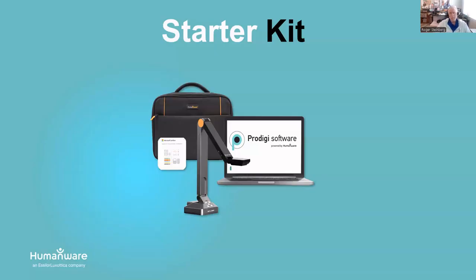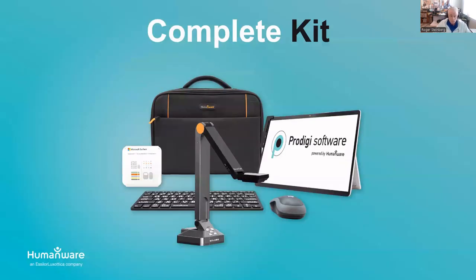On the right, you see a laptop, and this is sort of the setup that I'm using today. I'm going to use my work laptop with the setup of a starter kit to the left. So the laptop doesn't come with it. However, you can see the software that is installed on that screen there, and that does come with the starter kit, the software you would install on your own PC. So this is the option that someone would have if they needed a camera and the software and ability to move their camera about. This is the option they would look at.